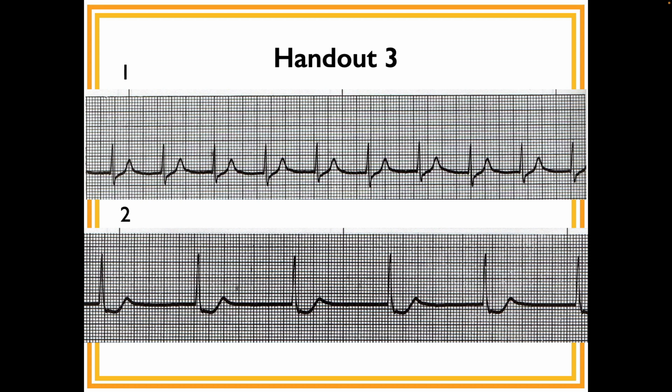Well, it's one of the junctional rhythms. Accelerated junctional. Perfect. And do you remember what's the limit of accelerated junctional? It is 60 to 100. Yeah. Now, everything you said was perfect. I'm going to comment that it's fine that you mentioned the T waves, just as long as you recognize that in the process we're doing now of identifying what it is, the T wave is irrelevant.